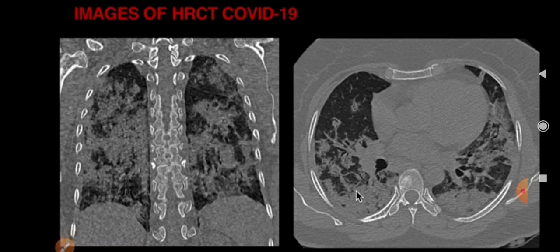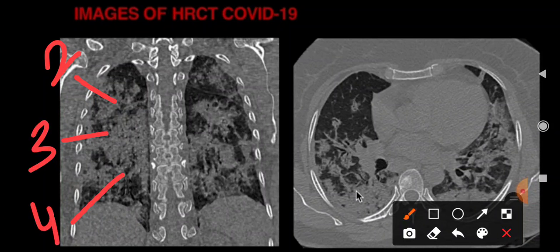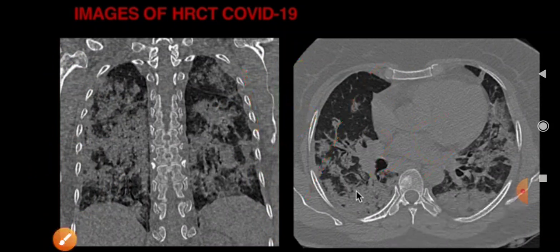So guys, I already explained the 5 lobes. Let me give you a quiz. If there is involvement of 2 in the upper lobe, here involvement 3, here 4, and this lobe involvement 1. For example, consider this one normal, and here involvement is 5. So the total score is 2 plus 3, 5, 5 plus 4, it's 9, 9 plus 1, it's 10, 10 plus 5, it's 15. This is not the same picture, but a 15 score out of 25. So this is categorized as moderate.